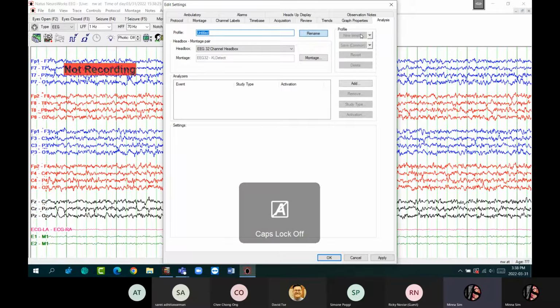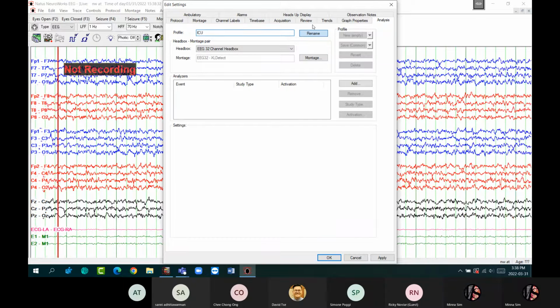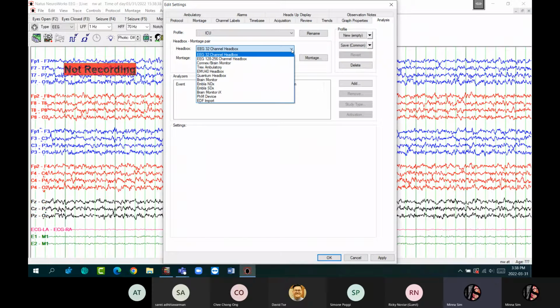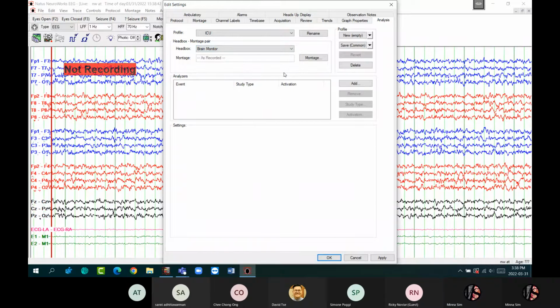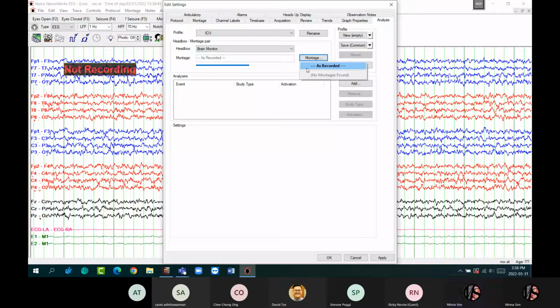You click New Profile and you choose a name, for example, ICU. And we have the head box. I'm using Brain Monitor right now, so I'll use Brain Monitor. And montage, you can choose as recorded.